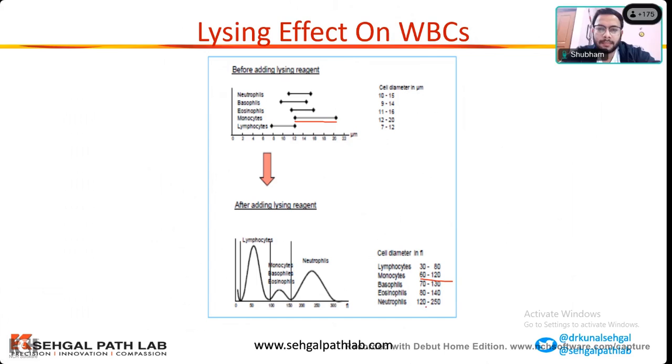So that is the challenge when we are seeing these kind of cases. We should know why monocytes are falling in mixed, whereas neutrophils are bigger. It is because of the impact on lysis. Okay, so I will move to the next slide.